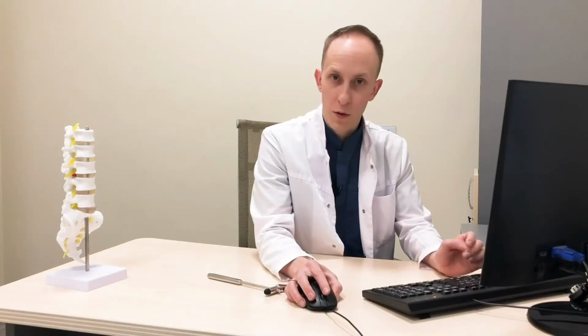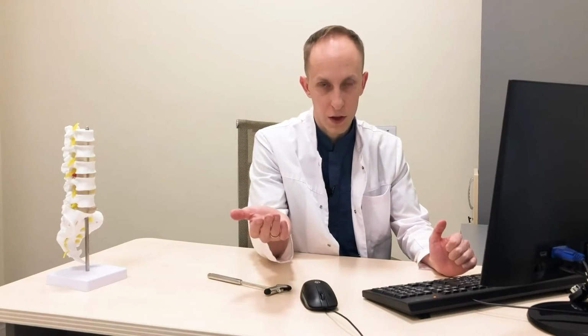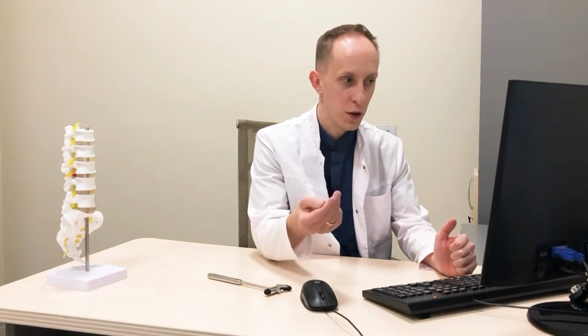The pain in his leg is radicular. On the MRI, we see the compression of the root. This all corresponds to the clinical picture. Accordingly, we are sure that his pain is related to this. What tactics are possible here? Taking into account the fact that he has been ill for only 2 weeks, in fact, he has not been treated in any way, he needs to be prescribed medication first of all.